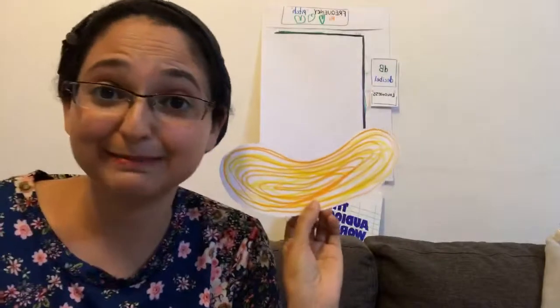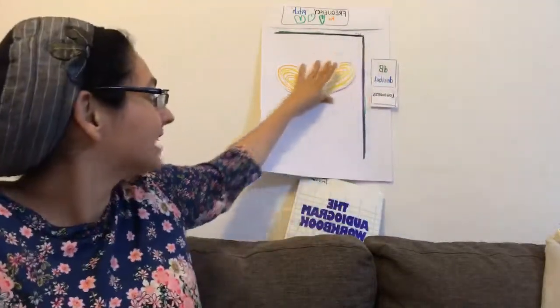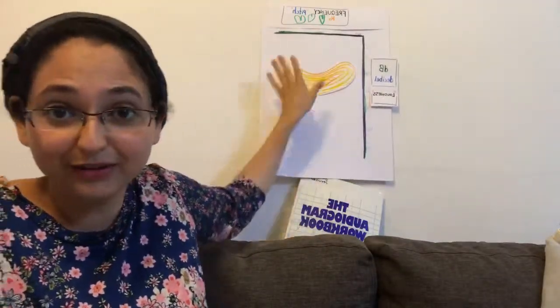And the other thing that you may have heard of is the speech banana, which, if you have an audiogram, sometimes just a blank audiogram will have this kind of shaded region right here in the middle in the shape of a banana.